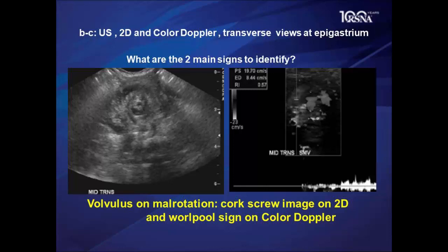Here, by ultrasound approach now, this patient had on 2D imaging something like a donut sign, but one would do a color Doppler to identify the vein with duplex tracing, which circles and strangulates the SMA, the so-called whirlpool sign.